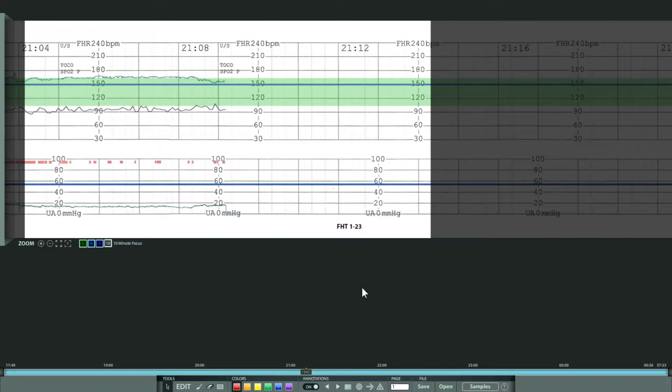Going over some of the tools that are down below here. First I have under the tools button is a paintbrush. So I can choose my color. I'm going to go with green, and I want to circle this and maybe change it to purple, circle that.